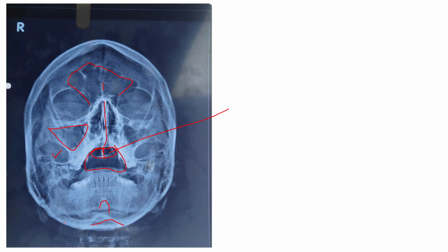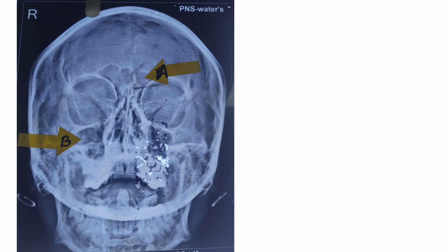First vertebra you can see here. This is your occiput, and this is margin of base of mandible. And what else you can see here? This is our orbit, margin of orbit. You can see here the petrous bone will be lying here.